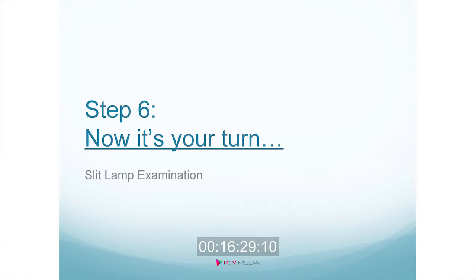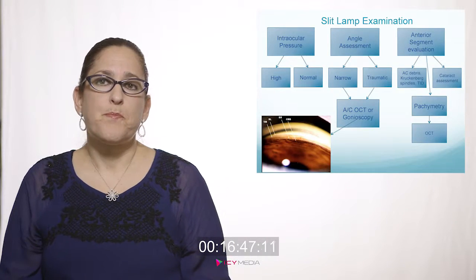Now it's your turn, okay? You've obtained all this information from your technician. You're stacking fundus photos. You weren't so impressed with the optic nerves, with the damage on the ganglion cell complex, with the damage on the visual field, and now it's time to put them behind the slit and try to make some decisions about how we're going to deal with this patient.